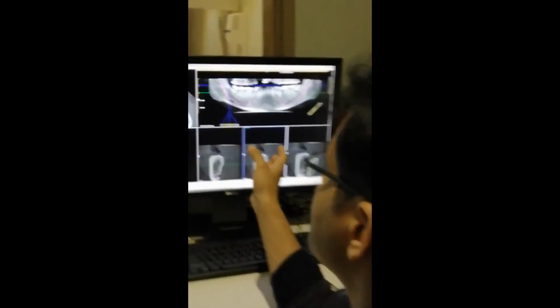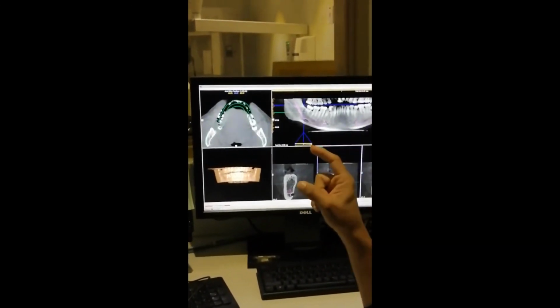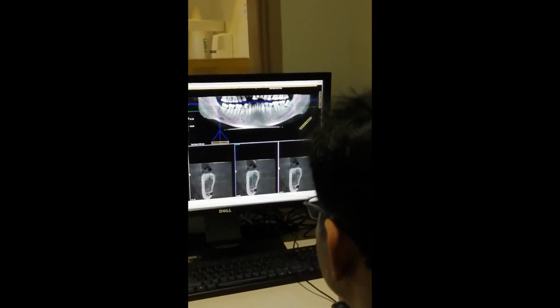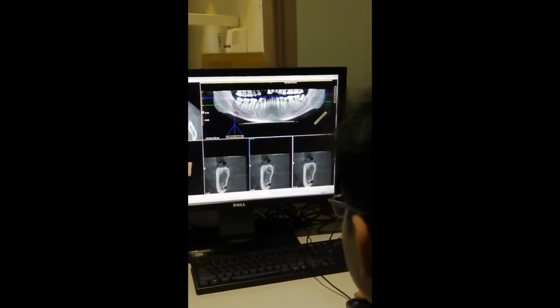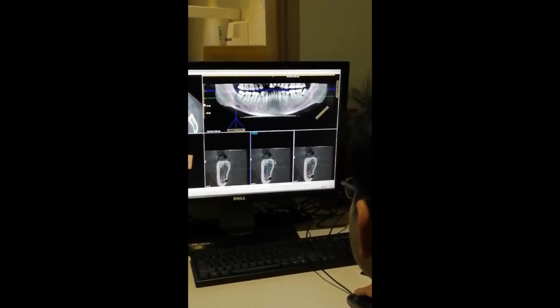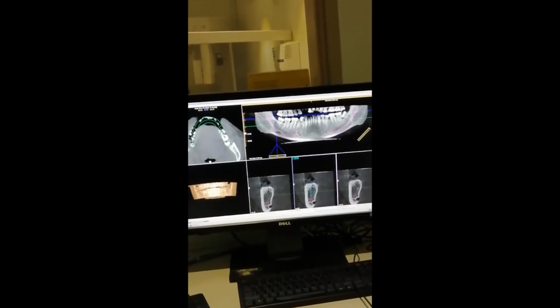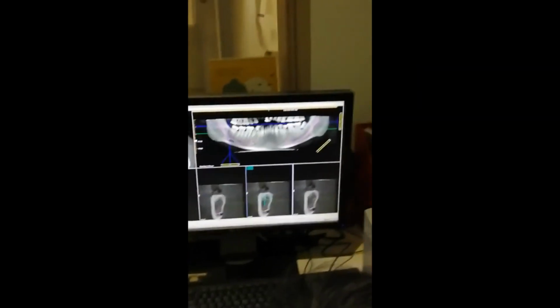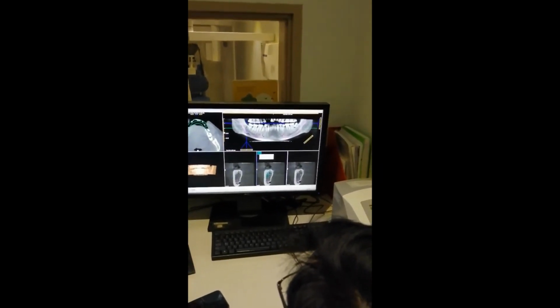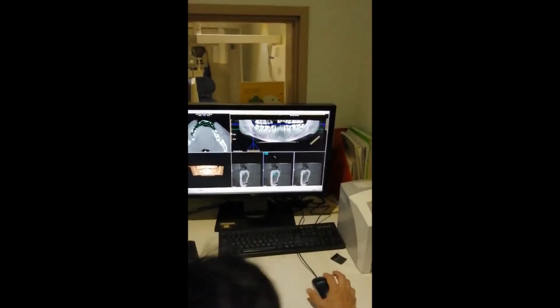Okay. So implant height differs, right? All those things you are going to learn in later days. How much should be the height, how much should be the distance from one tooth to another tooth, all those things. And my job is just to show you all the different tools now. Okay. So this is height and this will be the width. See. Click. And then leave it. Height and width. So width can be measured in any dimension, anywhere. Okay. See, like this here. If you don't want the previous point, you can just right click and remove measurement or remove all the measurements. If I do not want, I will just remove one. Okay? So this is up.